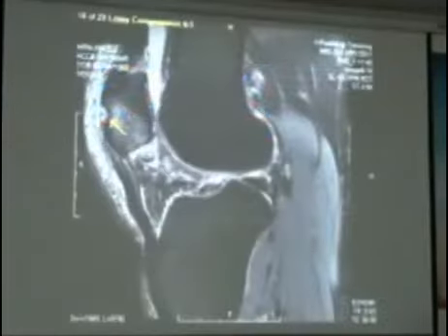So they had an MRI on that occasion. And you can see here the MR shows a cortical defect within the patellar tendon. So minor erosion, and you can see here that there's bony changes, very bright or brighter signal within the patellar tendon itself.